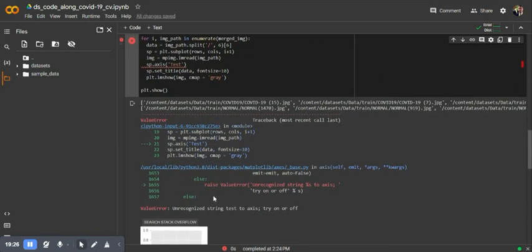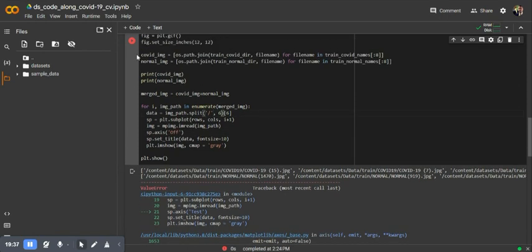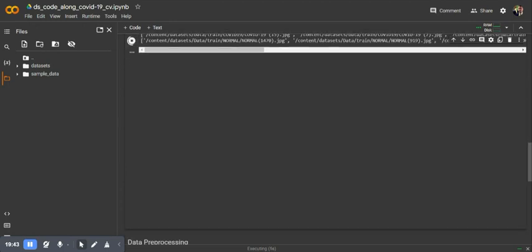What's it saying? Recognize. Okay, off. Got that confused with the set title, because I had set title in my mind. Turn it off. There we go, and that should do it. Boom. So let's just let that load.